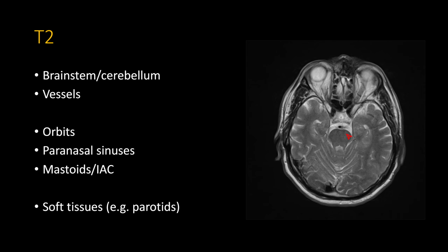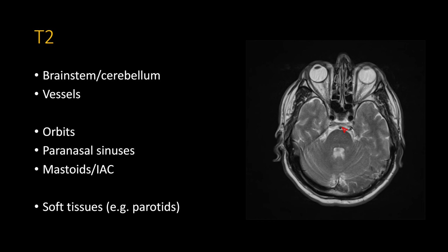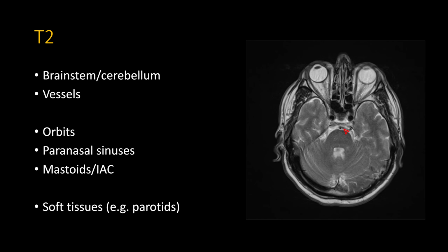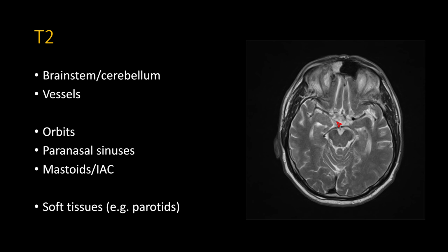As an aside, in this particular case, there is sort of this not-abnormality, a developmental variant. You have this basilar artery here, and there's another vessel coming from the basilar artery, a very beefy vessel, and it's going towards this internal carotid artery. Typically, the basilar artery itself isn't directly connected to the internal carotid artery on either side. There are these posterior communicating arteries here. See, this is the posterior communicating artery going to the P1 segment, P1, P2 junction.